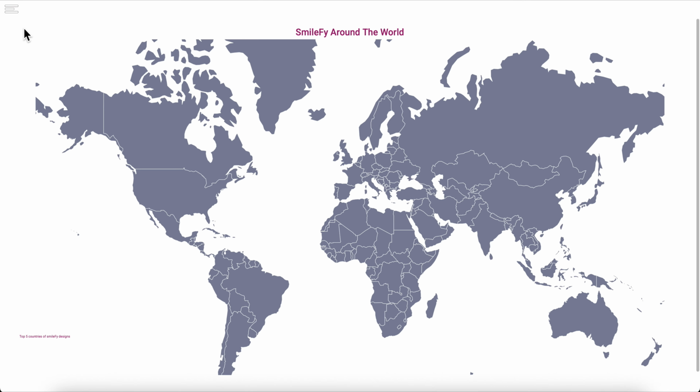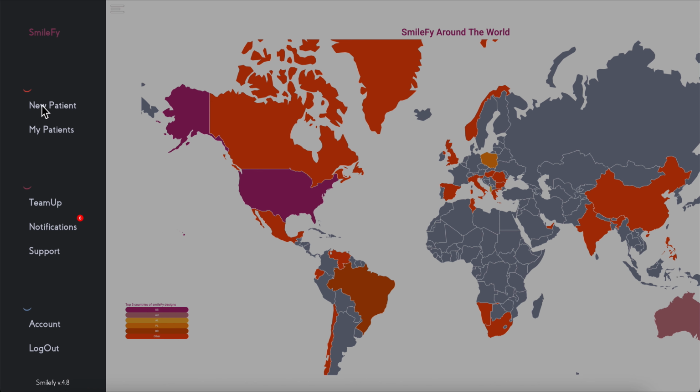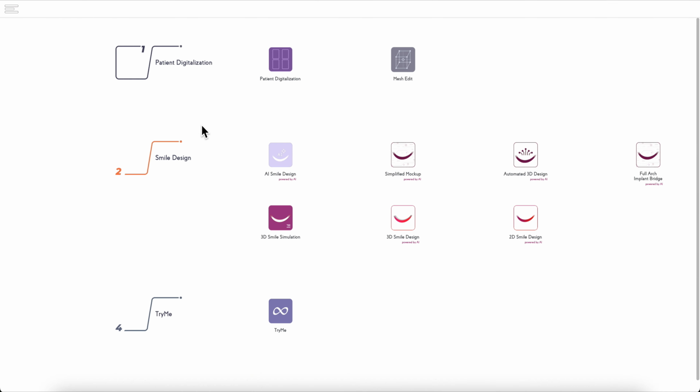Welcome to SmileFy. Today we will explore how to start a new patient, how to prepare the maxilla and mandible images for designing and printing, and how to calibrate your files.